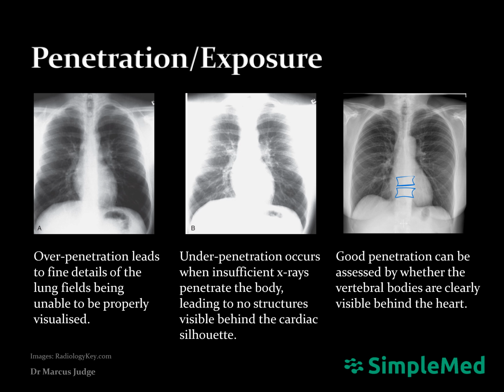On the left, we see an example of an overpenetrated image. This causes fine details and the lung fields to be improperly visualized, which leads to a clear possibility of pathology being missed. It can be difficult to identify that a film has been overpenetrated.